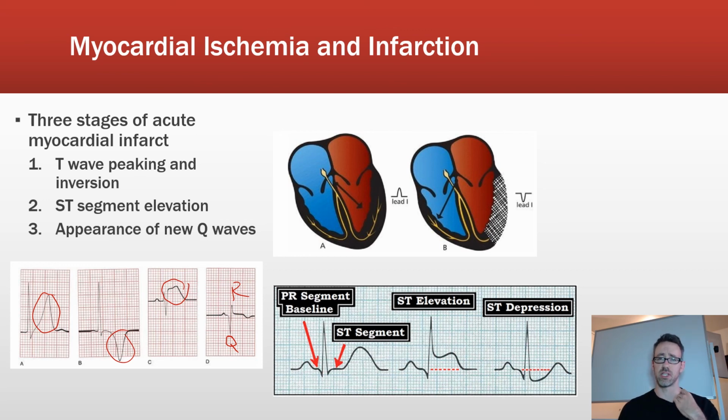With a Q wave, any leads that show these Q waves, the Q waves again have to be pretty deep. They have to be larger than one of those small boxes. And in general, for a Q wave to be more pathologic, the depth usually has to be about 25% of the total length of the QRS. It also has to be found usually in what we call contiguous leads, or leads that anatomically are connected to one another, like 2, 3, and AVF. So to see a Q wave in 2, 3, and AVF means you probably had an old inferior infarct. Or in 1, AVL, V5, and V6, you have Q waves there. They all correspond to the left lateral side of the heart. So that's what we mean when we say contiguous leads.